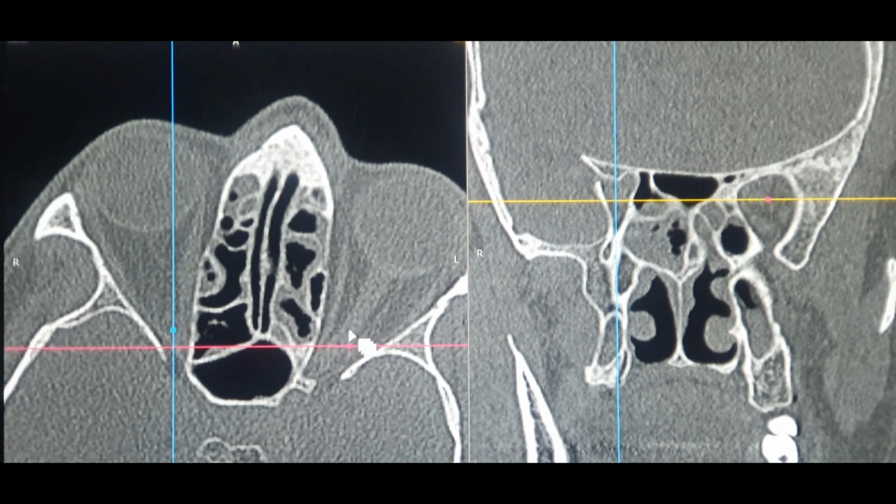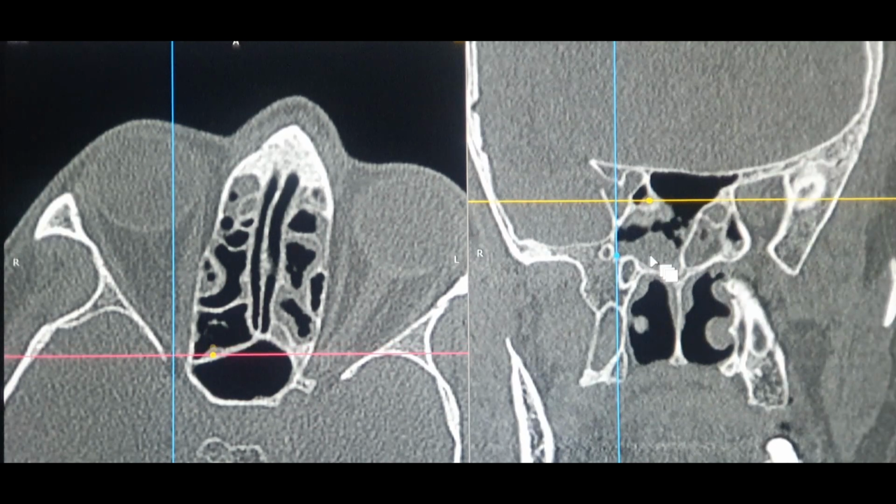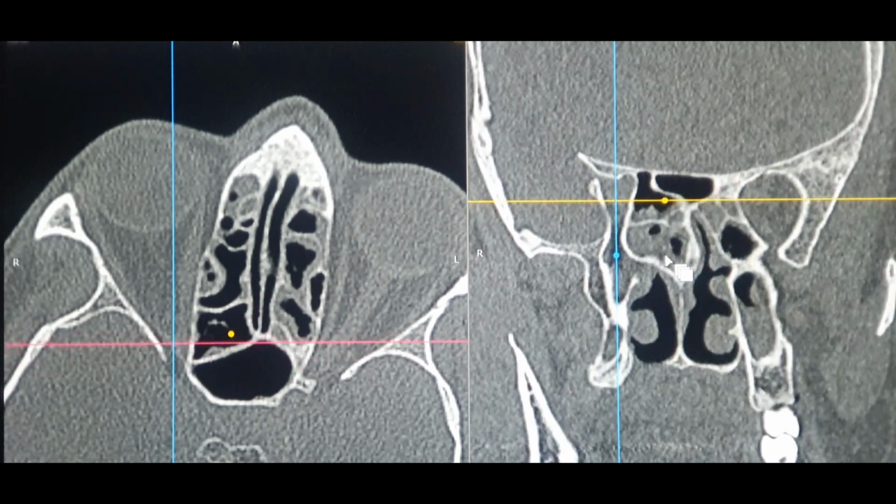You can actually see the optic nerve coming over here in the sphenoid area and forming the orbital apex. So this has to be the area of the superior orbital fissure near the orbital apex. Exactly posterior to the orbital apex is the superior orbital fissure, because of the structures, the neurovascular bundles which come from the cavernous sinus. Now wait, I'll show you the cavernous sinus first over here on the CT scan.